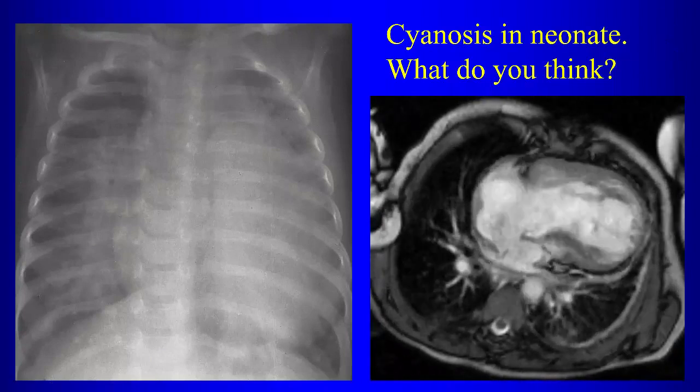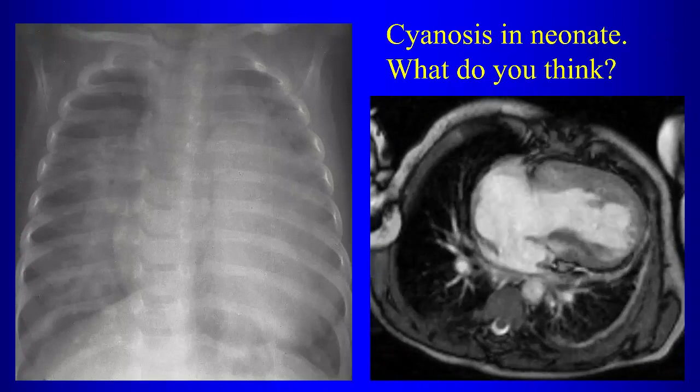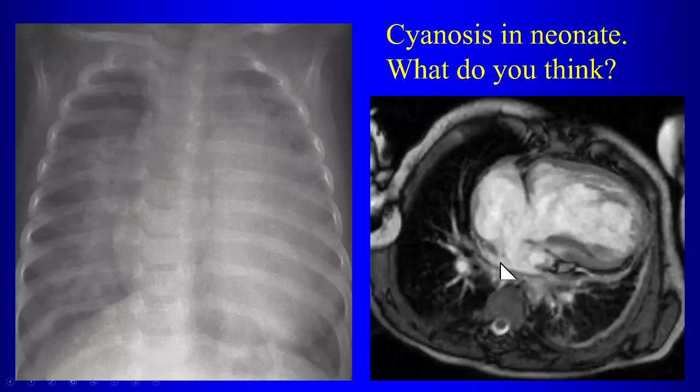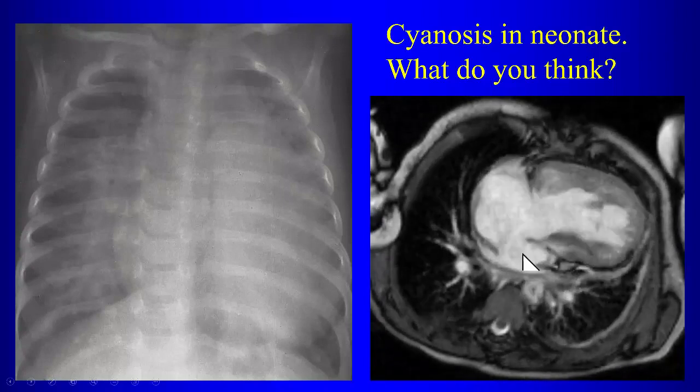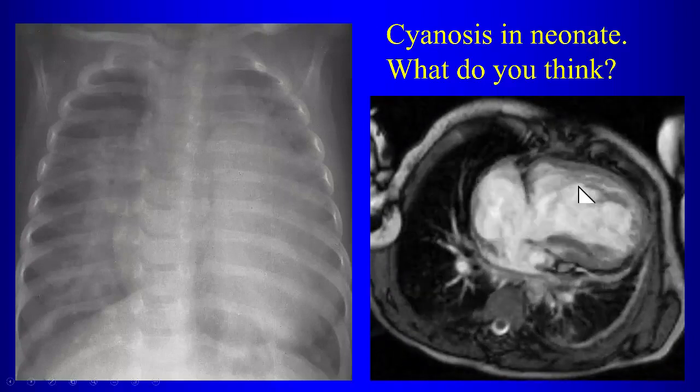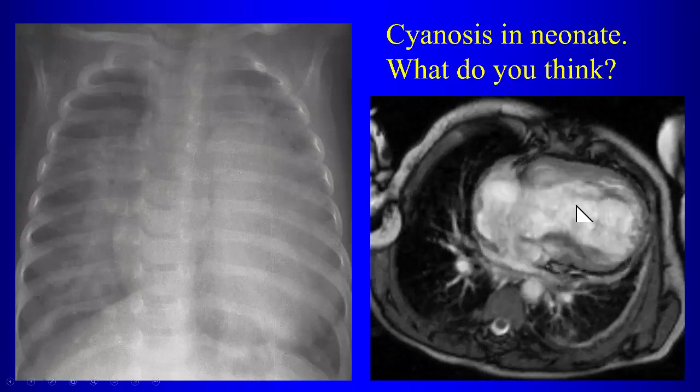So what are we thinking about? Single ventricle. Well, let's take a look here. What chamber do we think this is? That's the left atrium. Left atrium, okay. This guy, right atrium. Already we noticed what? ASD, large ASD, right? What chamber do we think this is? Right ventricle. Yeah, so that looks like the right ventricle, okay.